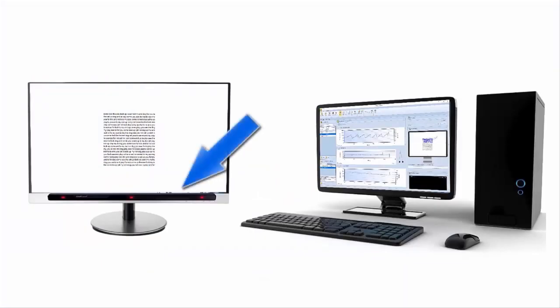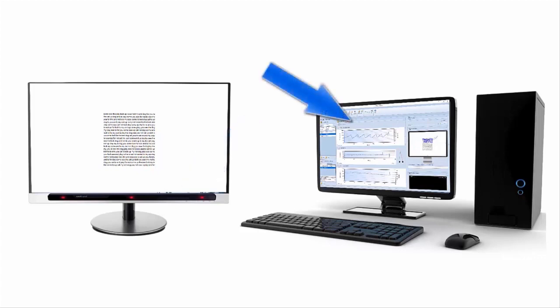The Clinical Eye Tracker consists of a Tobii eye bar and a powerful software suite. The software requires a PC, we recommend an i5 or faster processor, running Windows 7 or later. The PC must have a USB 3 port, which most modern PCs do. And you'll require two monitors. We recommend 24-inch monitors. The eye bar is attached to the lower bezel of one monitor. We'll call that the test monitor, while the other monitor is used to control the recording and analyze the results.